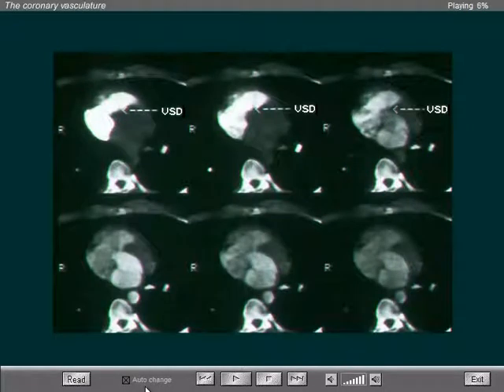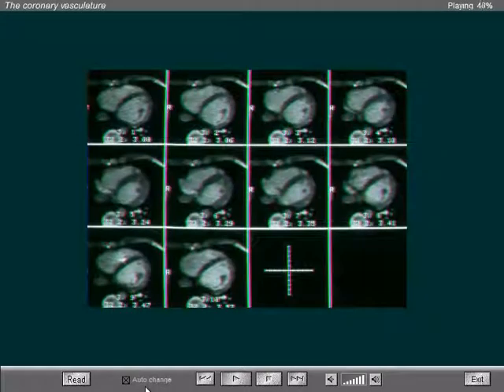The first case represents a ventricular septal defect. The site of the jet is illustrated in the top images. The second image is of the ventricular septal defect in another patient, showing a jet at the level of the mid portion of the ventricular septum. This is a common cause of a holosystolic murmur, and it's called the Roger disease.